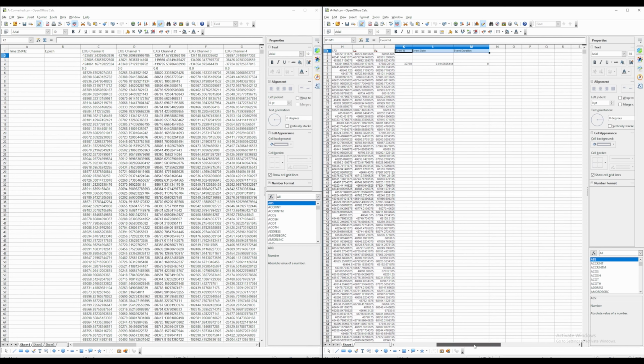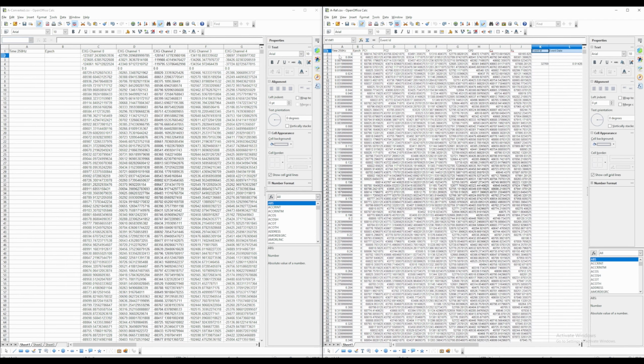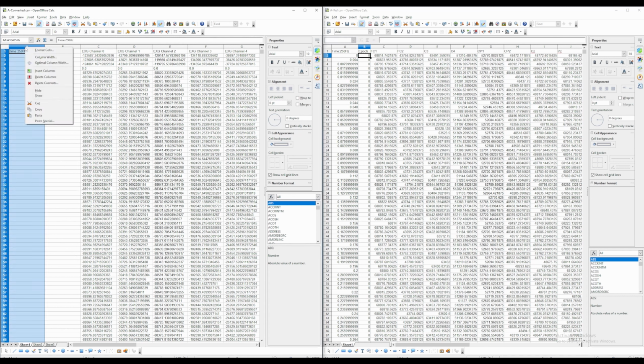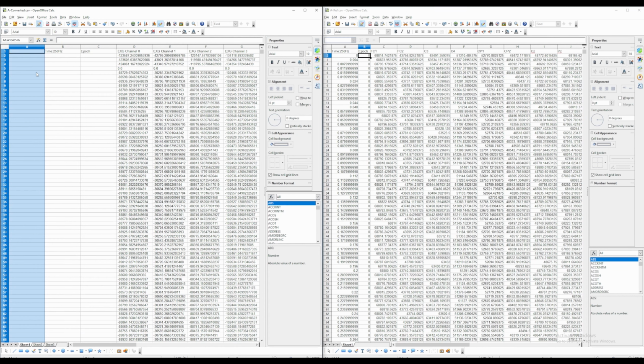So how are we going to create these columns? Well, there are a lot of creative ways actually to achieve this. I'm going to use a spreadsheet way. So I'm going to add another extra column here.